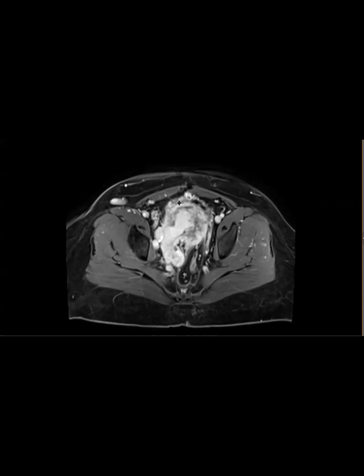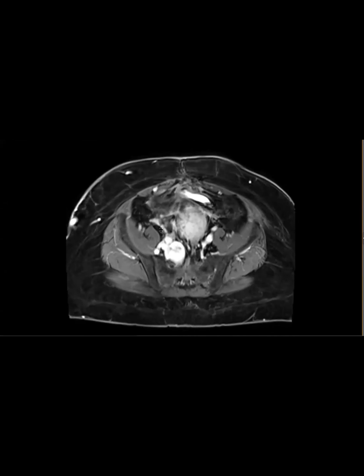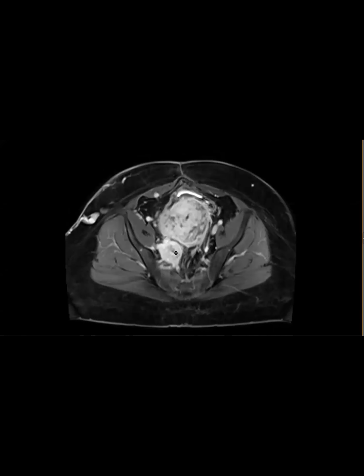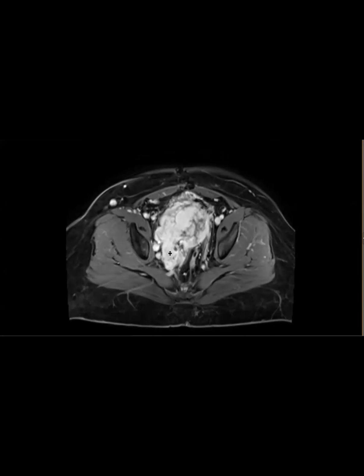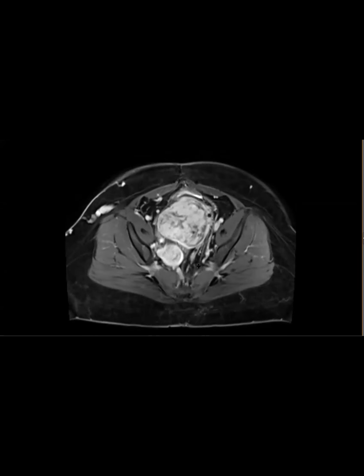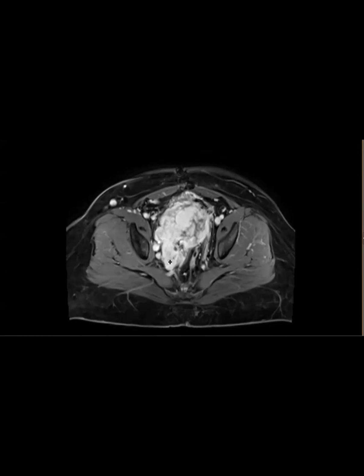In this case, we have the recurrence here, and then the mass grows into the collateral vessels. The patient had the right common iliac vein resected during the initial resection of the recurrence because there was intravascular invasion. So we have tons of collaterals, and the mass is growing into these collaterals. I've seen case reports where they show intravascular invasion of leiomyomas, but it was never this beautiful. It's just a phenomenal, great leiomyomatosis, and it's path proven.